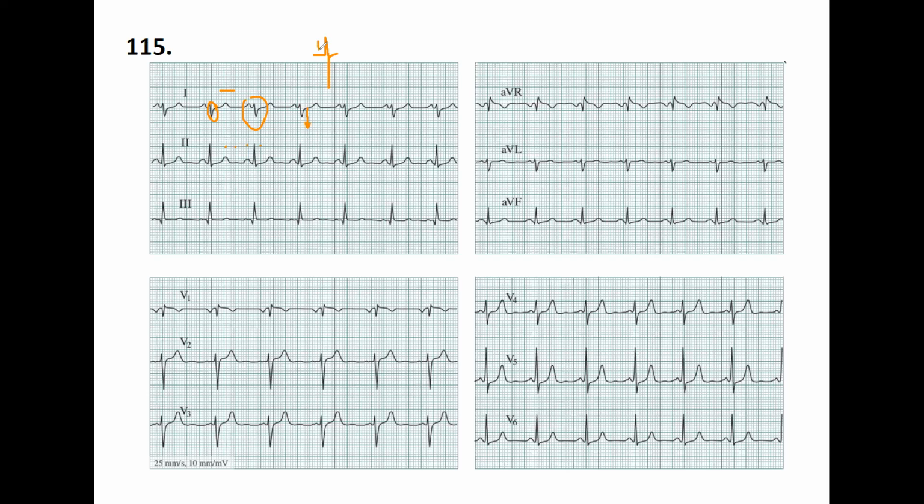You have to make a sum of the positivity and the negativity. Here, what you see is mostly negative. Here, for example, it means positive because it's more positive than negative, but you have to summarize it. So that's negative for sure.